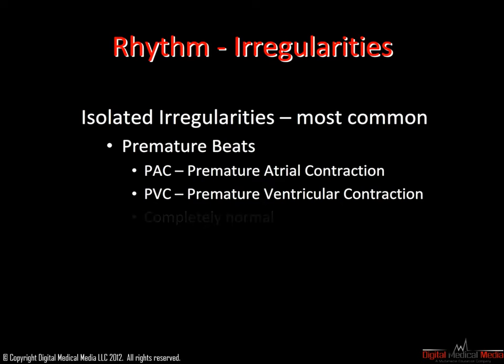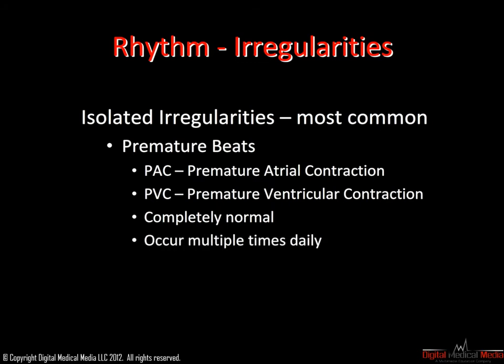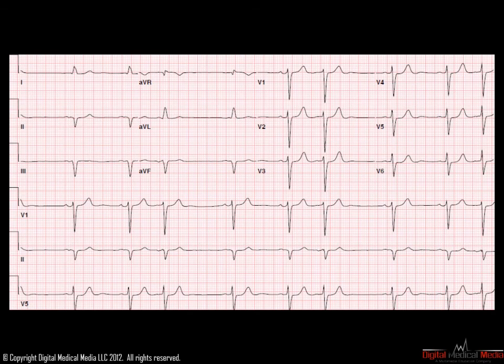PACs and PVCs are completely normal. Everyone has these beats multiple times throughout the day. They are not a cause for concern. However, they do catch your eye because they cause an irregularity in an otherwise smooth tracing. Here is a tracing with some visual irregularities.